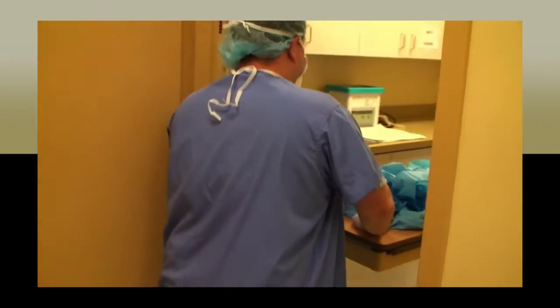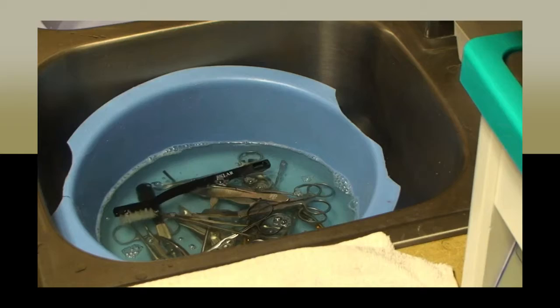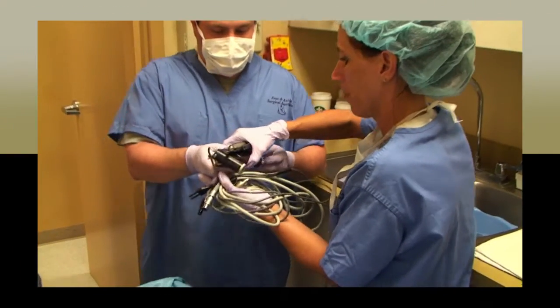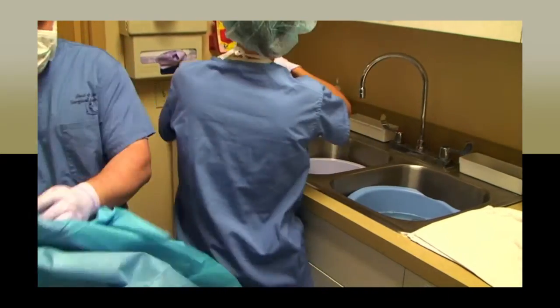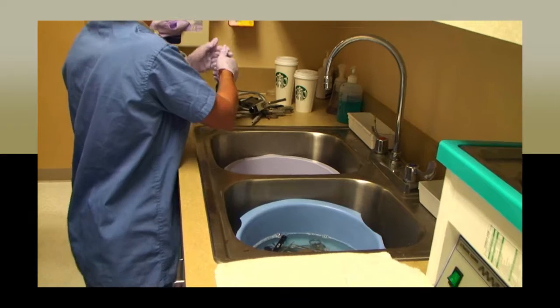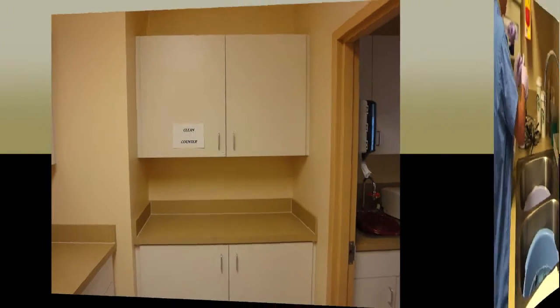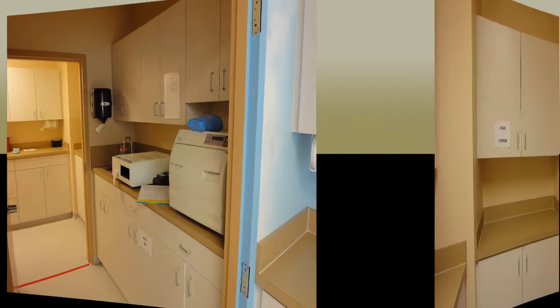All non-power instruments will be placed in a basin of detergent to be soaked, then scrubbed. All power cords and power tools will be sanitized by hand with a CaviWipe and placed ready to be sterilized. It is important that powered items and cords are not soaked. They will be ruined and rust. When items have been wiped down or soaked and scrubbed, they are to be moved to the clean nurse's station where they are ready to then be placed into the instrument container and be sterilized.